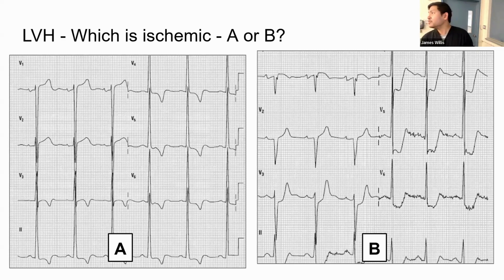B, yes. Who said B? Dr. Center. What's wrong with B? I hope you guys can identify. Look at these depressions. They're massive. There's like 10 mm depression. So yeah, very concerning for MI. Even in V3, you can think about a posterior MI.